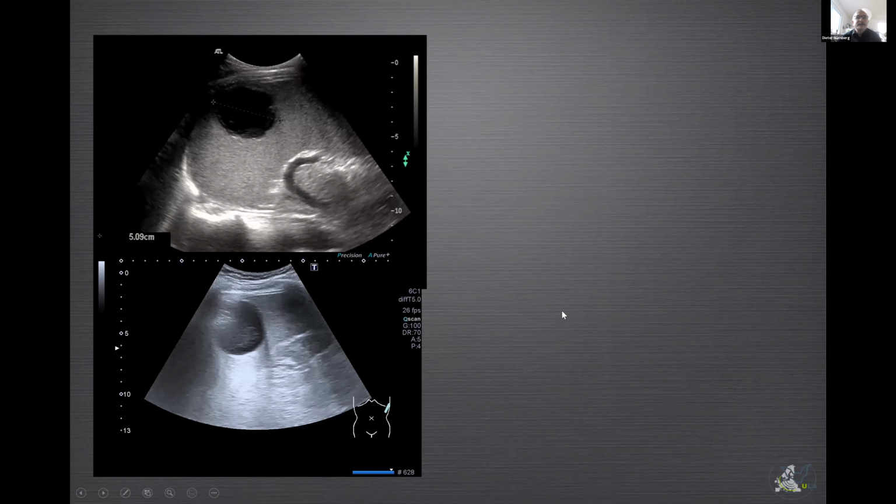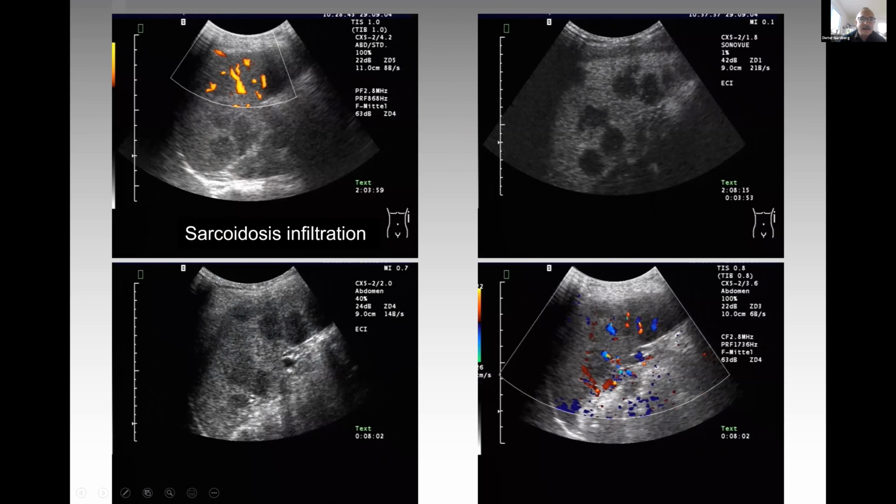And we can also see a lot of focal lesions there. They described in their paper cysts, normal cysts, and cysts with inflammatory content like abscesses, and also solid focal lesions like here. That was one of my patients with sarcoidosis. Because normally the people have a clinic, the incidental findings mean you can see them if they have no clinic and no laboratory signs.